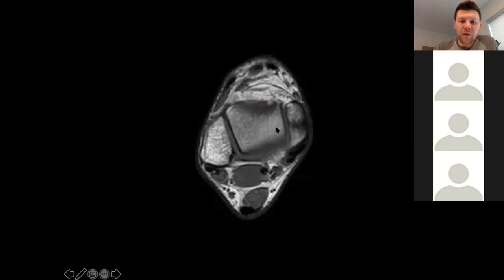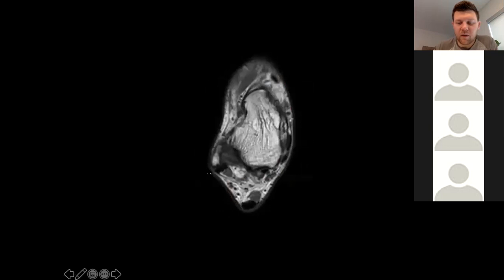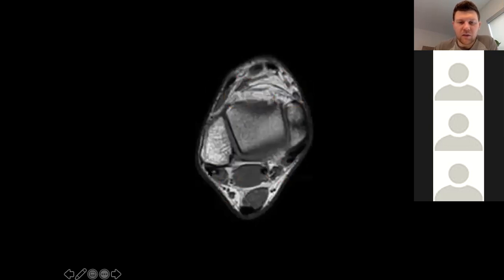All right, what bone is this one here? Talus. Good. What do we have here? The medial malleolus. Good. And what's this one? Lateral malleolus. Okay. So we can see which tendons right down here? The peroneal tendons. So here's our longus, that we don't have any muscle left, and here's our brevis right there.